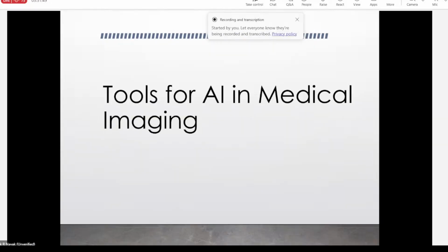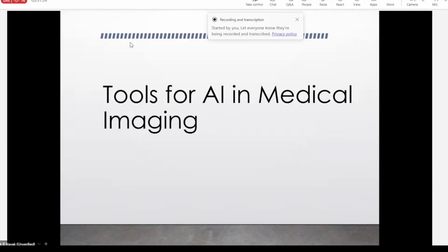So in this particular session, I'll be only showing you some demonstrations basically. Whatever we have learned till today, basically how to implement a medical image classification problem, and also I've chosen one segmentation problem, right? How to implement it with the help of k-means clustering. I will also check the chat box regularly. If you're having any doubt, you can directly interact with me.